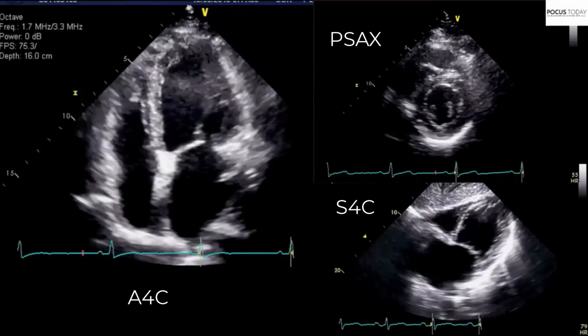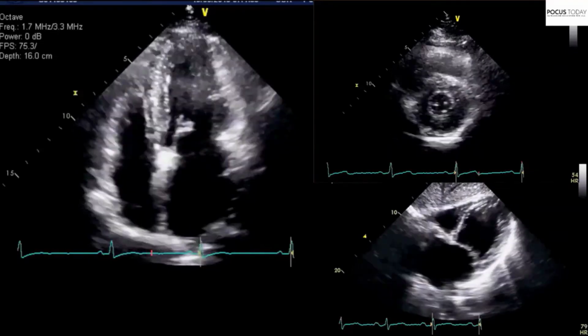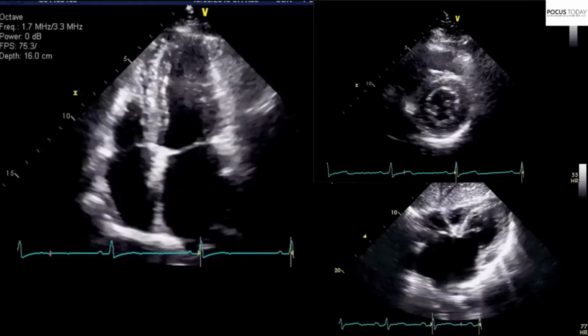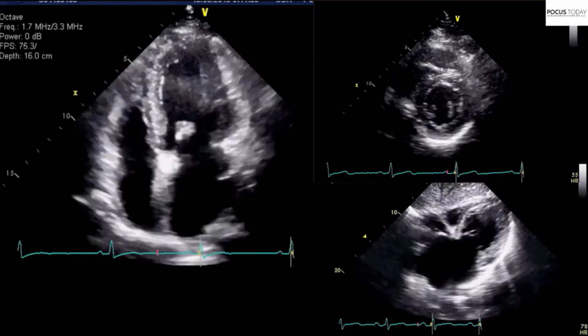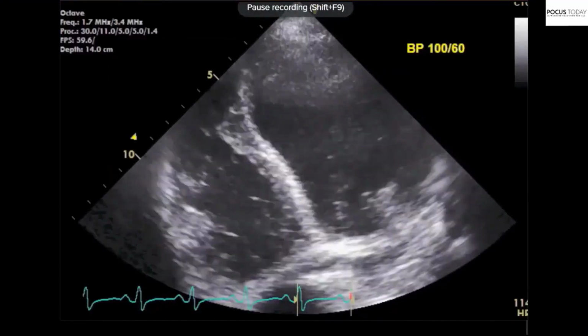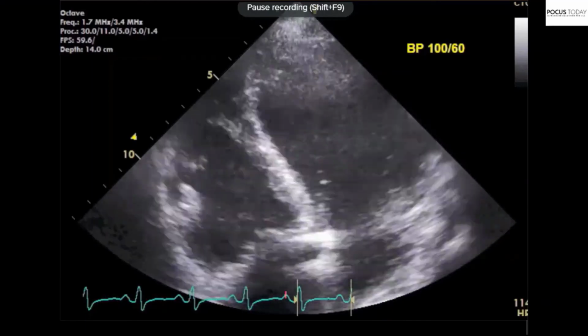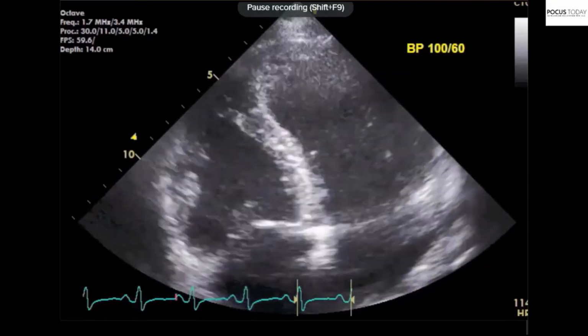It is important to remember ventricular interdependence when assessing the RV. We need to look at septal wall movement as well when assessing the RV. Normally, the septal wall protrudes into the RV during diastole. In conditions of RV overload, there will be septal flattening as pressure in the RV increases above that of the LV in diastole. This will cause the LV to have a D-shaped cavity.